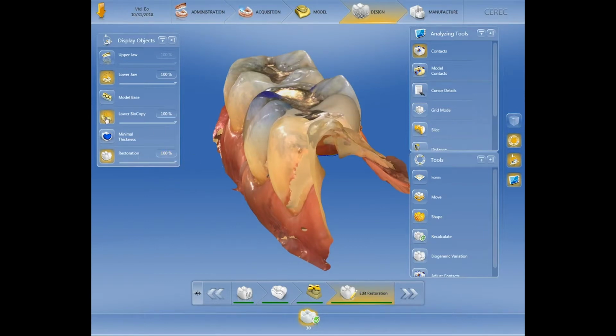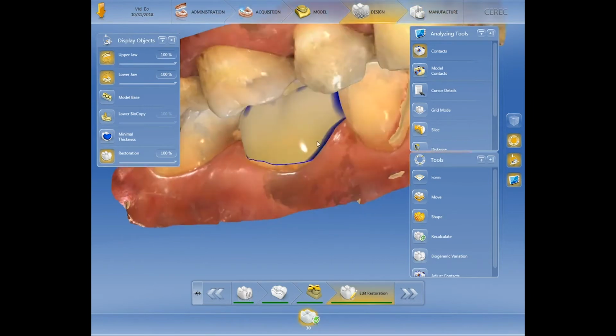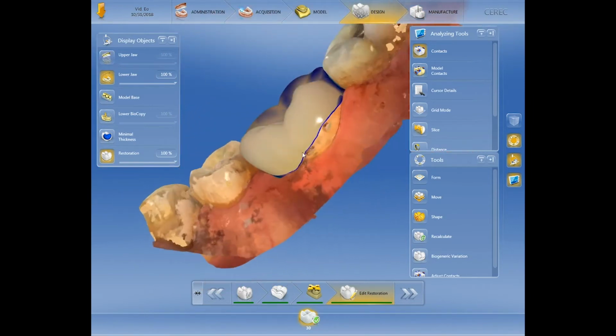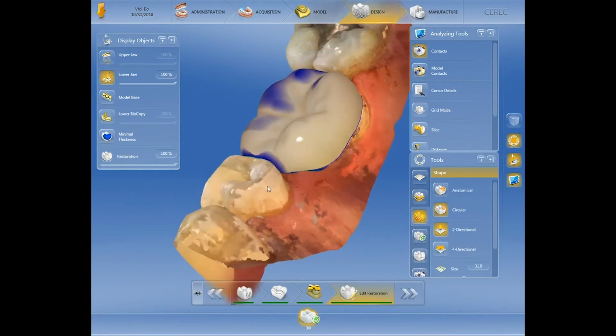Sometimes it's nice to look at the tooth from before and see that our tooth measures up in similar size and shape and contour. And here we're seeing that our lingual cusps are a little bit high in their proposal, but the existing distal lingual cusp was also very high on the tooth that we prepared away. We'll take that into account in just a little bit here when we're looking at interferences and adjusting occlusion.